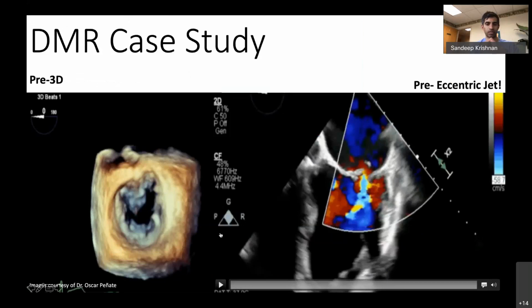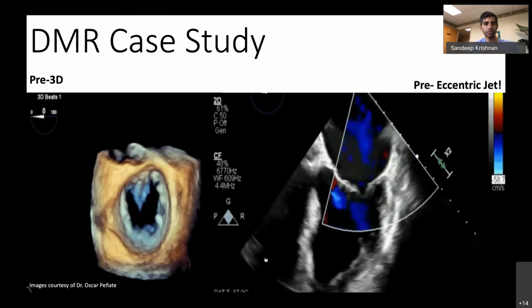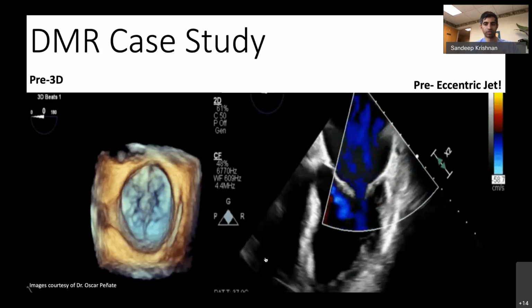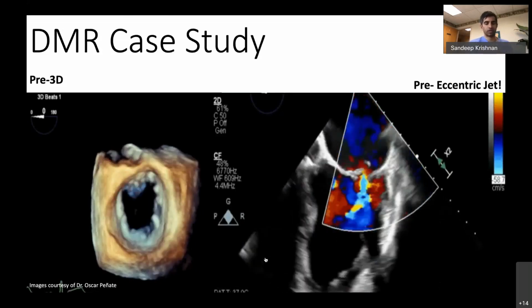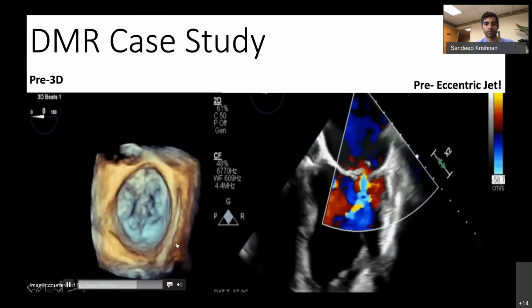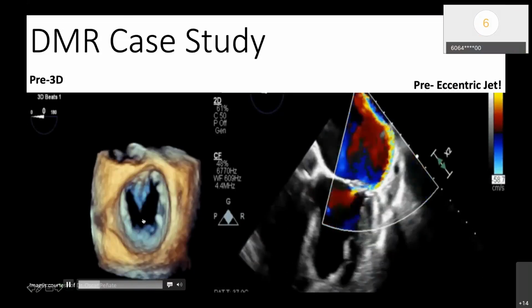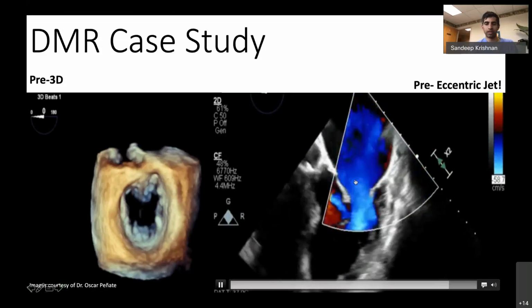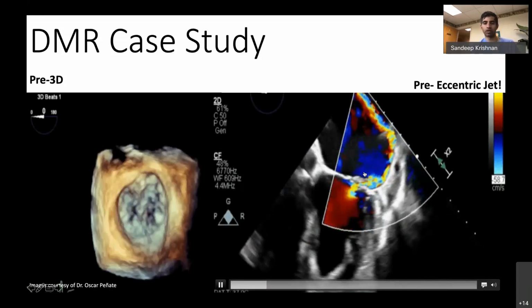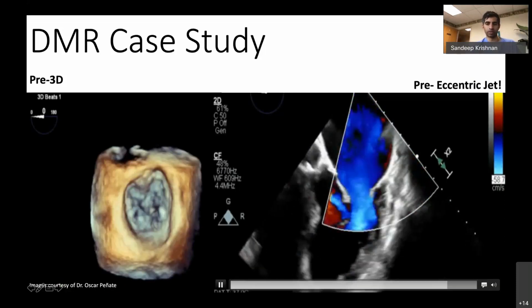He's been living with severe degenerative mitral regurgitation, or primary mitral regurgitation, for a long time. And here's why. Can you guys tell what his anatomy is? What's wrong with this valve? Obviously, it's a very leaky valve, but what's the pathology here based on what you're seeing? Anterior prolapse. Yeah, but it's more than just a prolapse, right? You can see the flail anterior leaflet here. Yeah, it's a flail. And this is the difference between a prolapse and a flail, because a flail almost always will cause severe MR. A prolapse will not always be related to severe MR. It just depends on how bad it is.